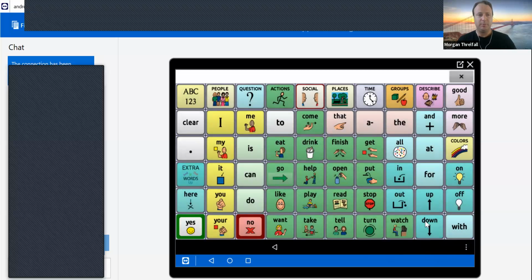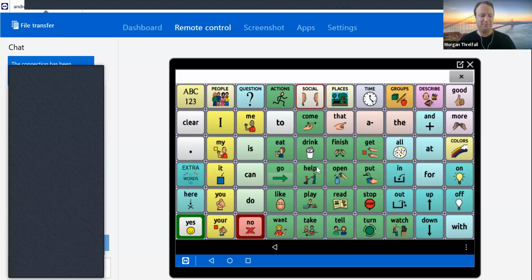And you can personalize WordPower by adding in icons that are important to the student. I'd recommend not to go overboard with this, otherwise you'll be adding everything in their life into there and you'll be customizing it forever.